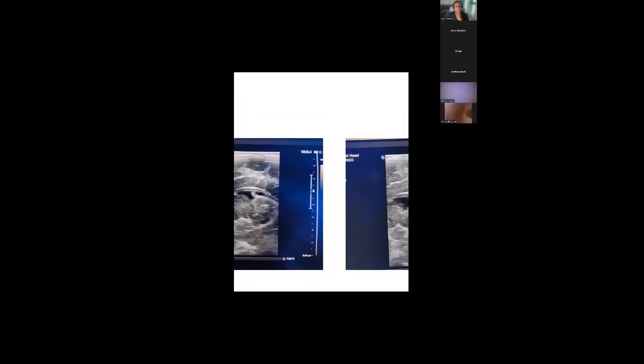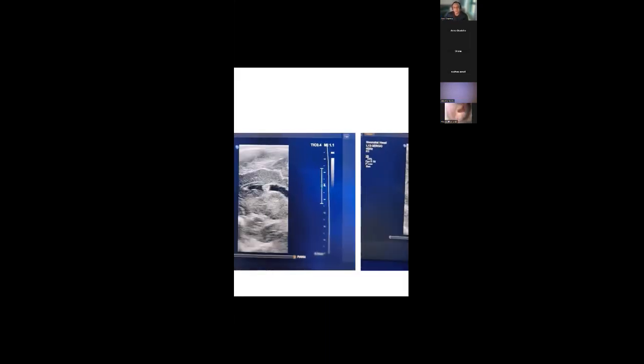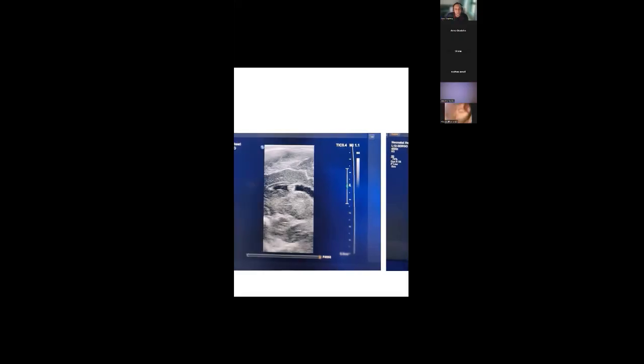So I really know this is right. This is definitely choroid, extended a little bit into the ventricle, I don't know. Sometimes in situations like this, you can get choroid just as an isolated pocket in the middle.